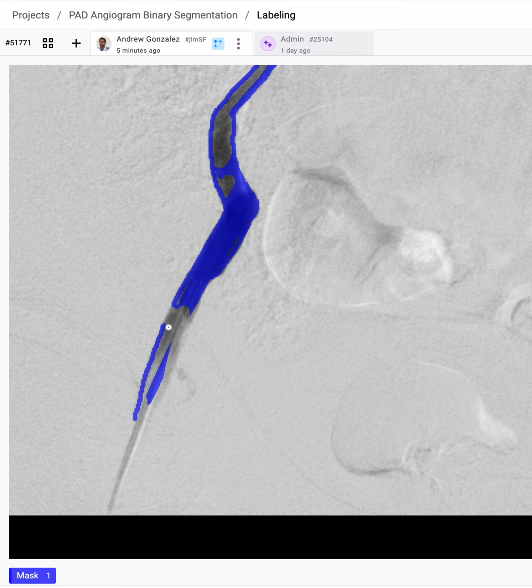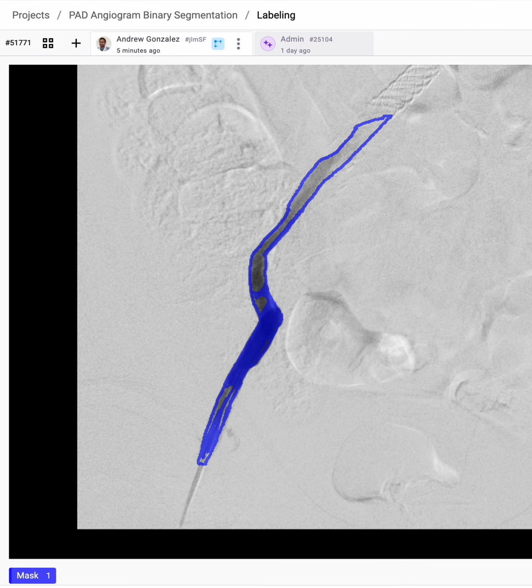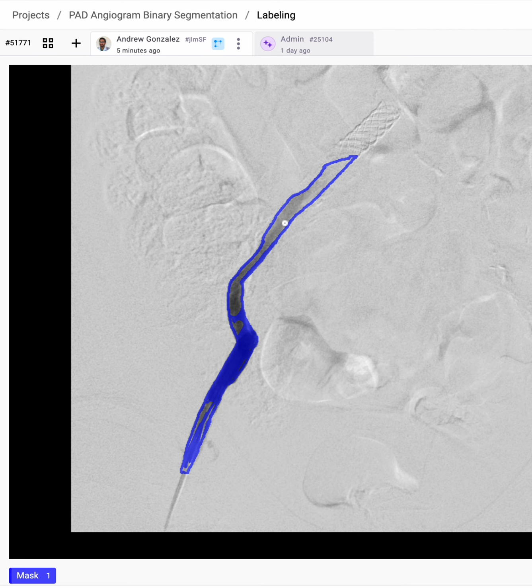So here, and you can see it has a tapered nose cone on the other side. And then wherever these sort of edge walls end, I almost always just come straight across like that. All right, and then we just fill in. So that's what we're going to do now. So we just choose a larger brush and fill it in. That's pretty much it. But that went over a few rules for this one as an edge case.